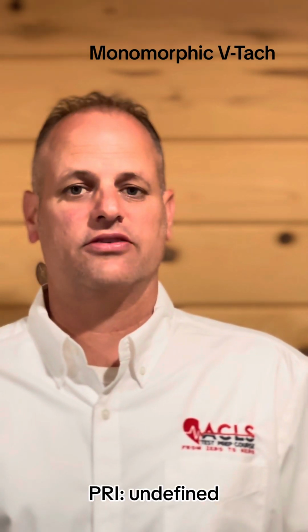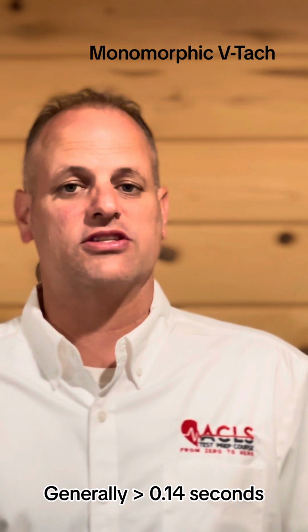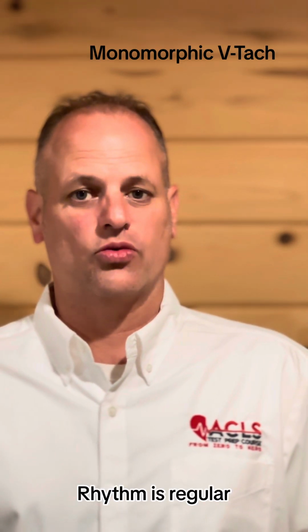PR interval, undefined. The QRS is going to be wide, and generally speaking, if you can measure it, it's going to be greater than 0.14 seconds. The rhythm is going to be regular.